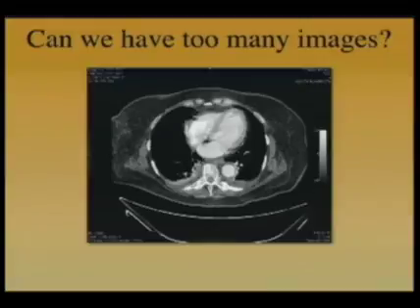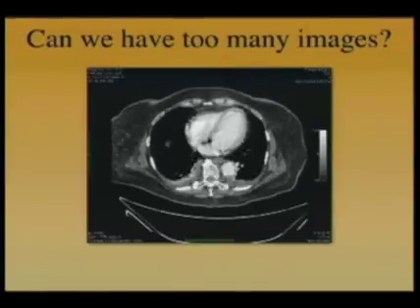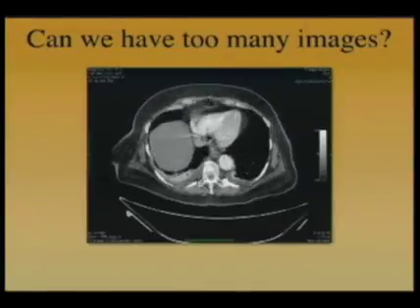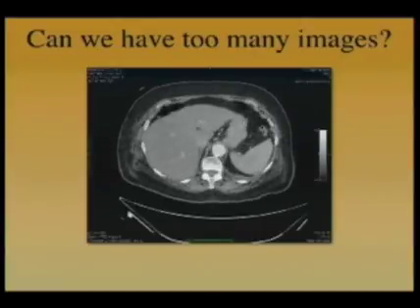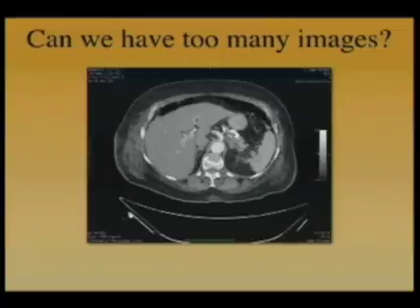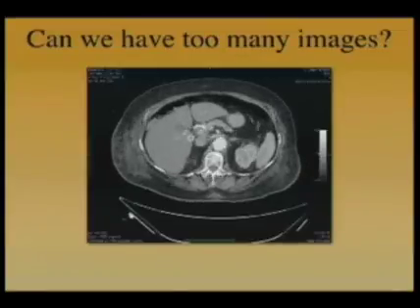The other question that arises is the one of having too many images. And I think anybody who does, especially CT angiography, has encountered cases such as this one, where you have literally thousands of axial images to review. And this could take a long time.